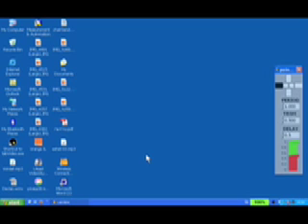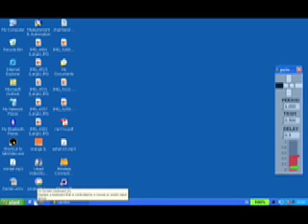So I'll just talk you through this video now as it commences. So you can notice that the system is just rotating across the positions until the downward position was selected by a sniff, and the cursor starts moving down until it was stopped by a sniff. Now the leftward direction is selected. The cursor will continue moving until it will be stopped by a sniff. And so here it was stopped by a sniff.